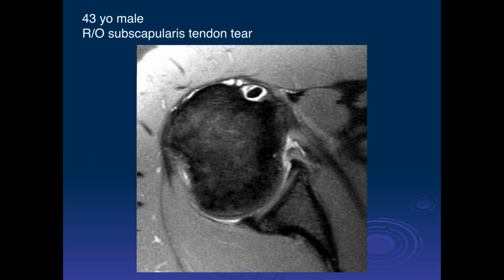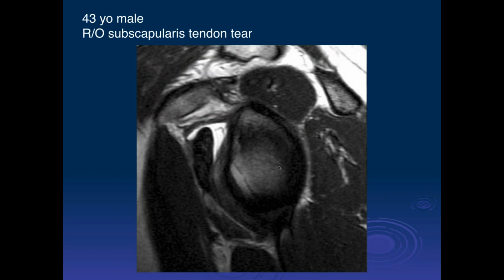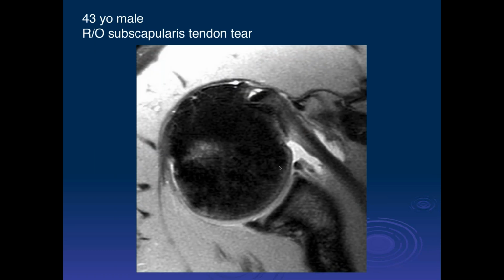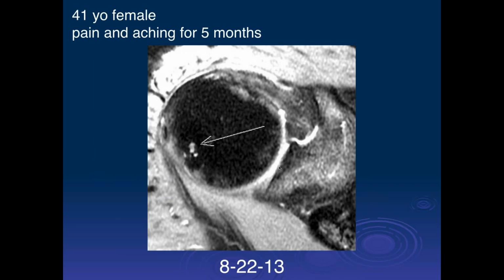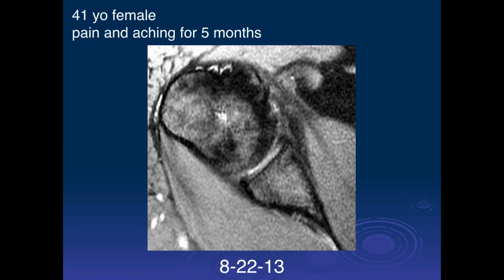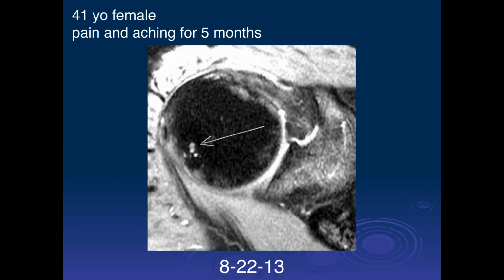Right in here. I thought it was an aggravation of a prior injury, because isn't that a Hill-Sachs lesion there? I think that's just a chronic insertion. This is normal marrow, just like over here. So I don't think there's an acute bone injury, and I think this is just a chronic tract. Okay. It was misinterpreted as a Hill-Sachs.